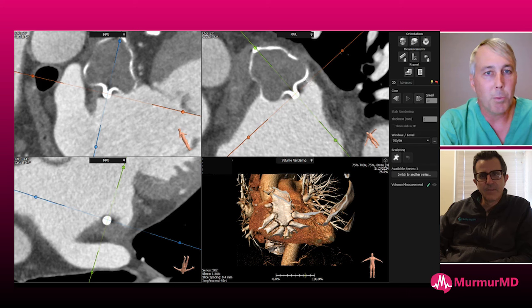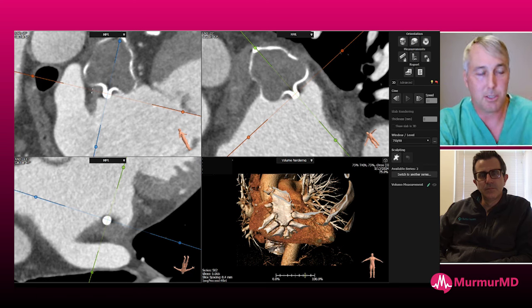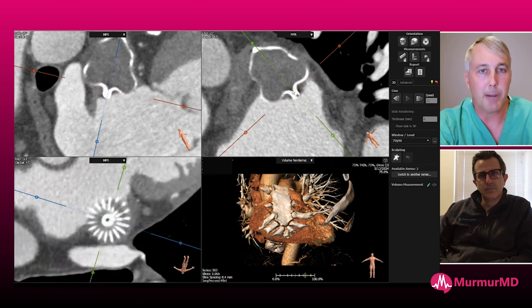And so what we've determined this to be, if you look in the top right, this is all thrombus underneath the fabric. If there were device-related thrombus, you would see something jagged coming off of this into the left atrium. So in this case, this is a tissue border over here on the device, and then a little bit of thrombus under the device, under the fabric.